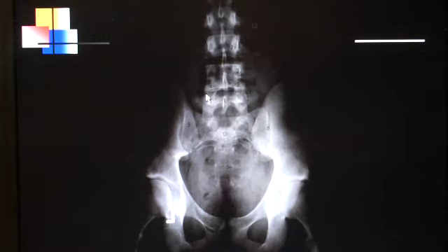Number 4 is, well, there it is on the transverse process, but again, they don't have a lot of density, so they're not showing up very well on this screen. Number 5 we just did is the inferior articular process. Number 6 is looking at the lamina, again, right up next to the spinous process is the lamina portion of the segment, whereas number 7, if I move my arrow out closer to the pedicle, I would be on number 7, which is the pars interarticularis. Immediately medial to the pedicle is the pars.